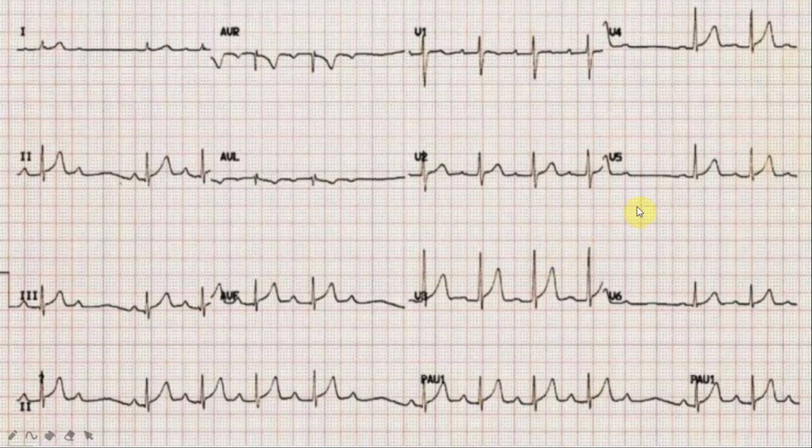Okay, so let's go through this first ECG that I have shown you in the very first slide. This is a 12 lead ECG. There are 6 limb leads and 6 chest leads. Becky, could you please interpret this ECG in the systematic way that I have just told you about, so that we don't miss anything. All right, the floor is yours.